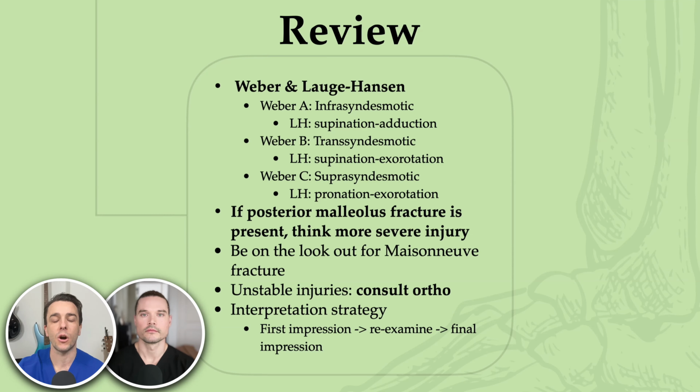Interpretation strategy should always be your first impression. Then you're going to re-examine those films with the Lauge-Hansen mechanism of injury staging in mind, and then give your final impression. Everyone, that is ankle injuries.